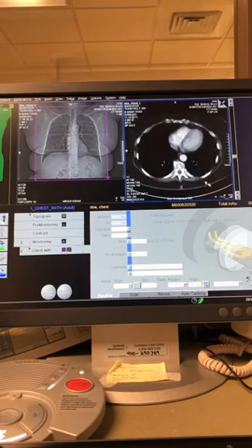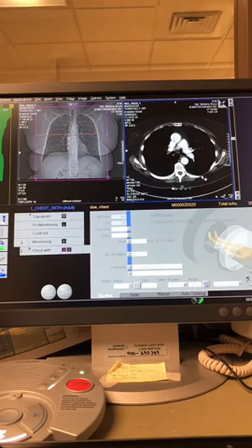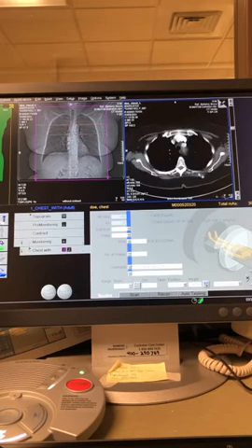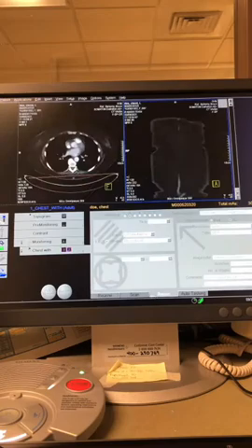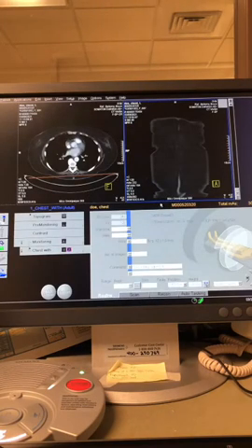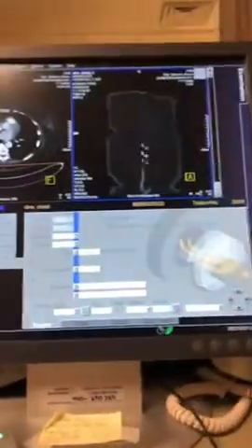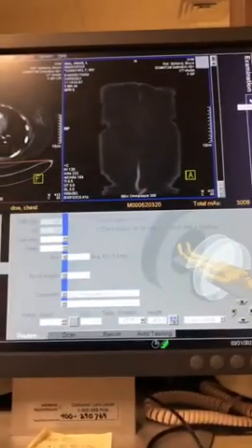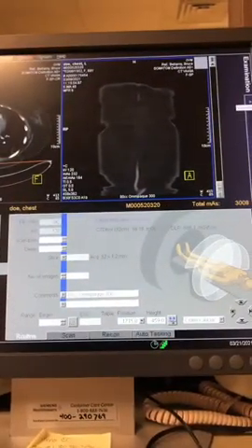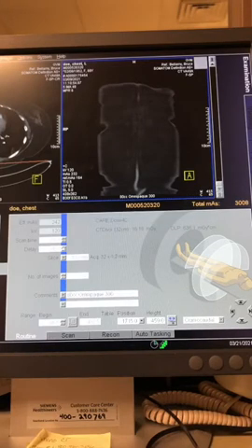So that's like how the scan will go. The whole procedure isn't gonna take 10 minutes. Like you lay them down and it's just bing, bing, bing. So let's dig into this protocol a little more. Let's look at what the chest looks like when it's scanned, okay? Let's go, we've got our routine tab here. I'm gonna come up closer and just on that, so maybe you guys can look just at the routine, or these tabs. That looks good. All right, so we've talked about this before.